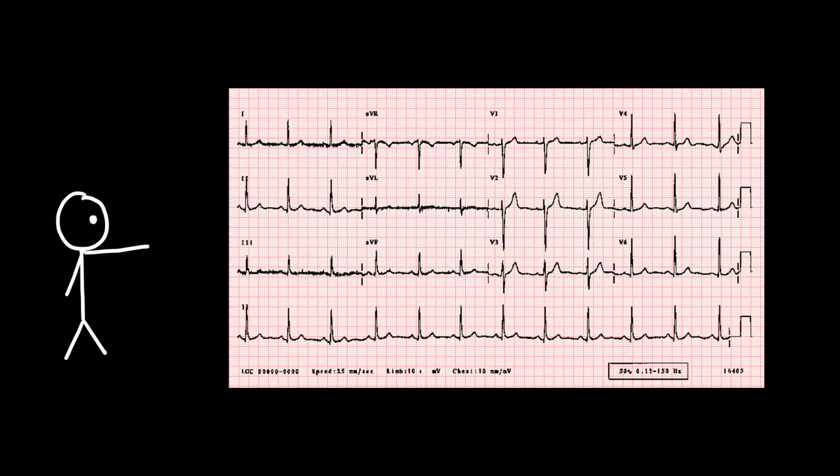When you look at an ECG strip for the first time, it looks complicated. Waves going up and down, lines everywhere. But underneath all of that is just a grid. A very deliberate, precise grid. With two sizes of squares.